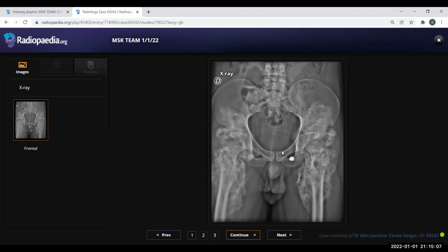No, I didn't mention. So this is a radiopaque foreign body. This patient has a history of gunshot wound. Okay, so he has trauma, he has spinal cord injury, and hence, as you said, this is myositis ossificans when there is traumatic injury, right?